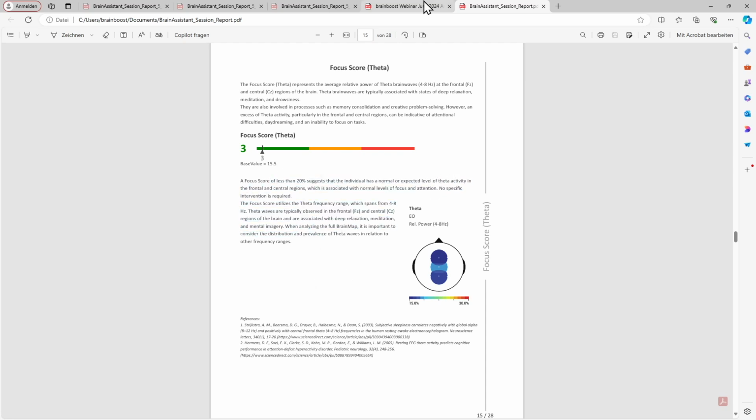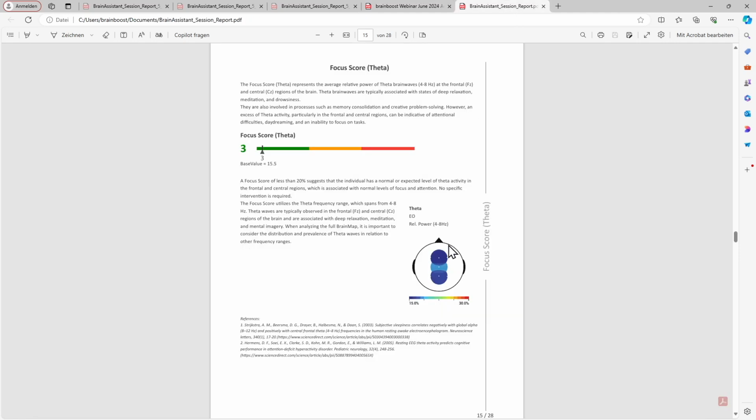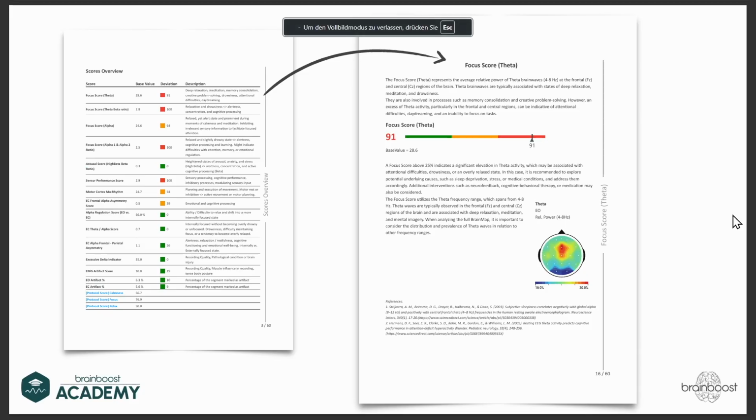So it gets the brain map automatically, but still I think with this view you can also get some nice insights, and also for yourself learn a little bit about why we would choose what training protocol and what we can see, and also measure. This is why it said first in brackets, do some in-between assessments. So let's say this with a full 19 channel cap was your first assessment, but after 3 sessions you say, okay, in this training I will place 3. Also with an Ego 24, for example, you can get this sort of a report if you only have 3 channels.